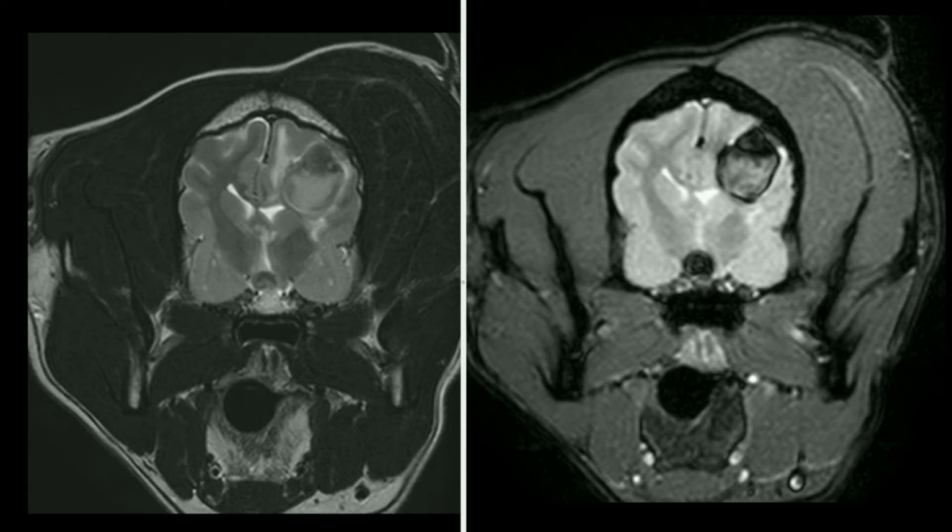Here we have the T2 star gradient echo sequence on the right and the T2 weighted image for comparison on the left. So in this case, the T2 star gradient echo sequence confirms that these lesions are hemorrhagic. Here we see the typical appearance of intracranial hemorrhage on a T2 star gradient echo or susceptibility weighted imaging sequence. Hemorrhage will typically be signal void or very low signal, with this distortion and blooming, which is due to the susceptibility effects of the hemorrhage.